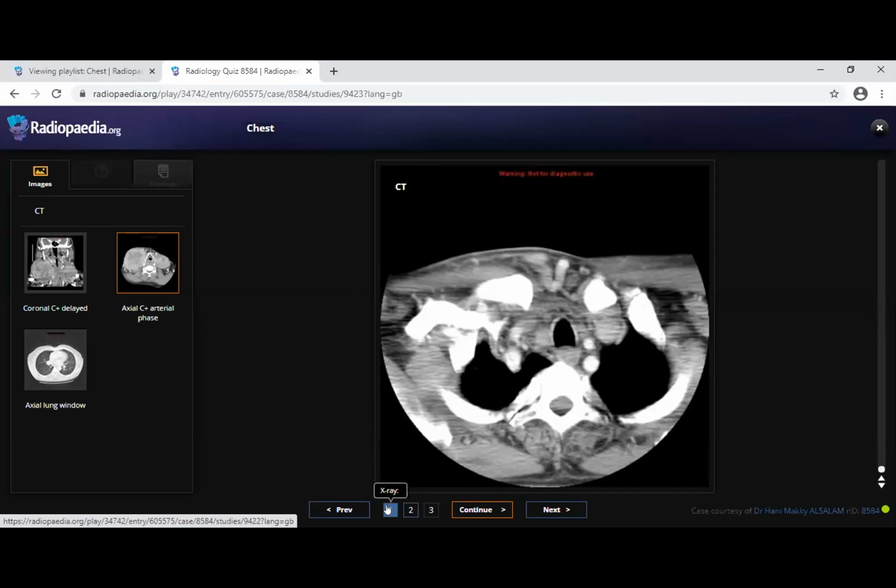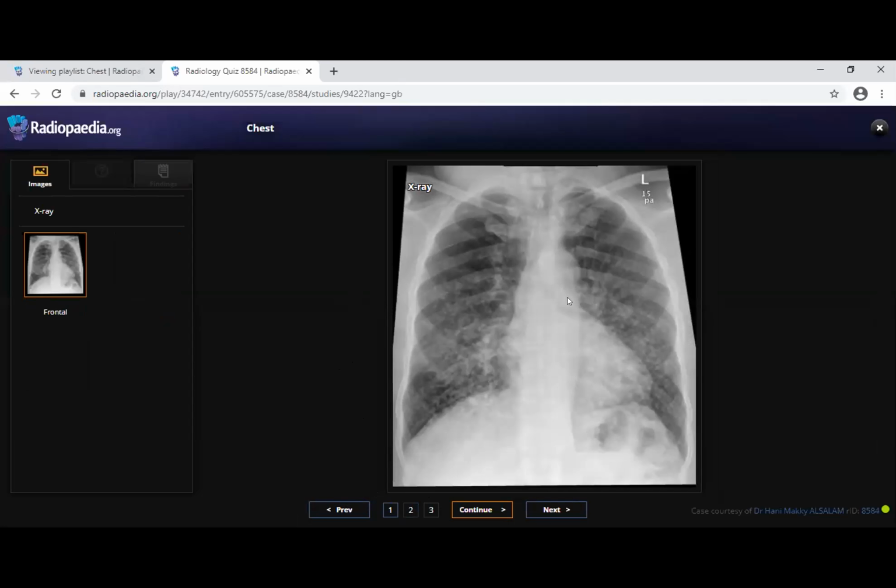Yes, please. Vala, you have done exceedingly well. In this radiograph, these are miliary nodules, and at the edge of the film you can see the soft tissue. So there is soft tissue involving the lower part of the neck. That is a pointer towards the primary lesion in the thyroid gland. Yes, okay.